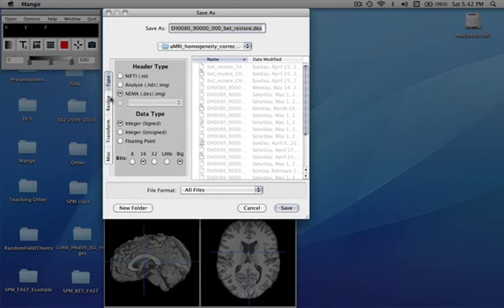And presently, we're in this format. Say we want to save it in that format or that format. It tries to come up with an appropriate name for us. And as we add more save types, we'll add them in a little list down here. And also, we need to tell it the data type and the endedness type.